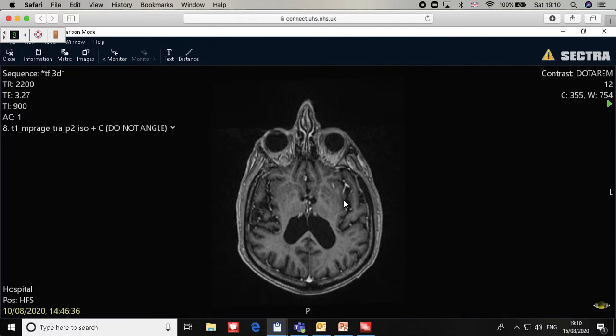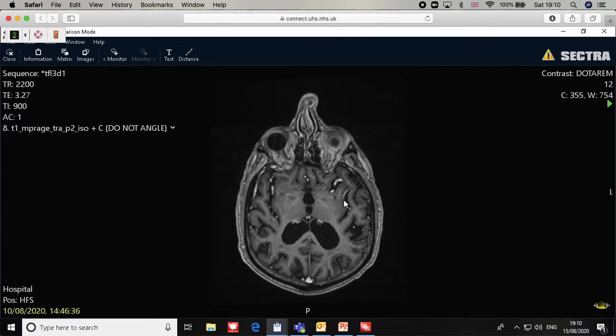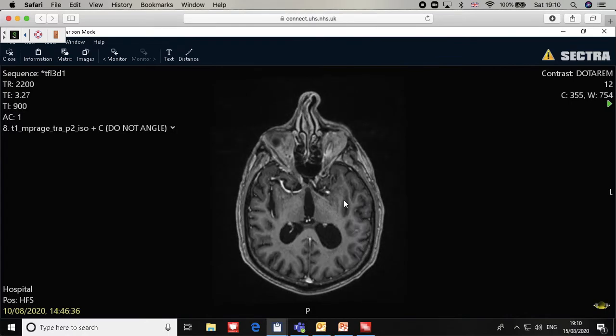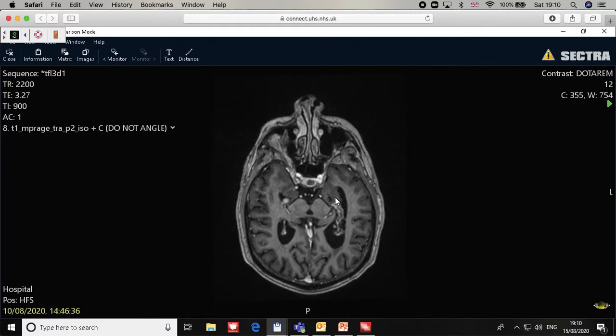Why do I want you to keep your eye on the axial view? Because, please write this down, any gray matter anterior to the lateral horn, the temporal horn of the lateral ventricle, is not part of the hippocampus. This will be the amygdala. So we don't draw the amygdala. For example, on the sagittal view, you find your structure coming, and then you find the structure coming anterior to it.